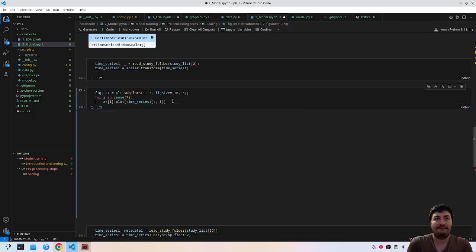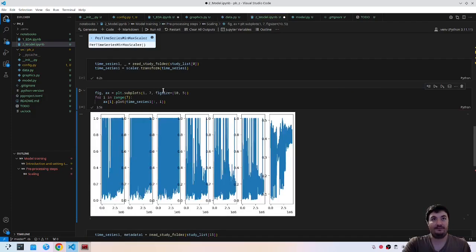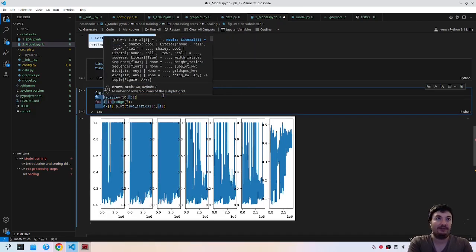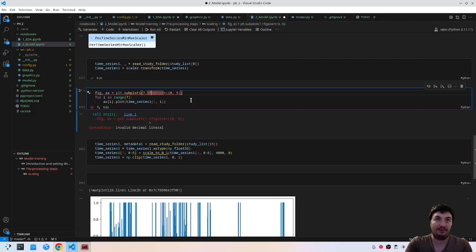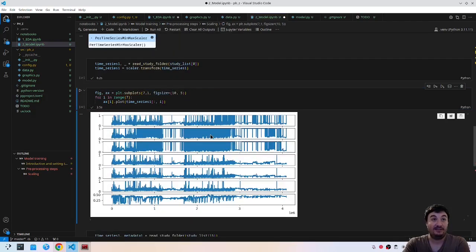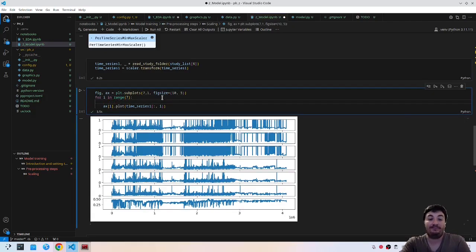Let's, and it's 0, 1, 0, 1, 0, 1. This is 0.5, but okay. With respect to the maximum value, 0.5 would mean like a pH value of 5 if we think of a maximum of 10. So okay, maybe this is not unreasonable. And then we have the other ones, 0, 1 without anything strange. Maybe we can open a new one.